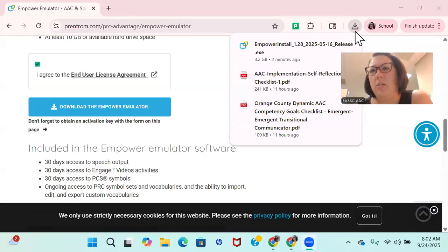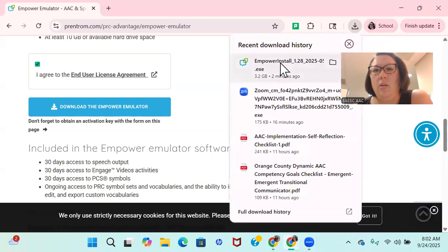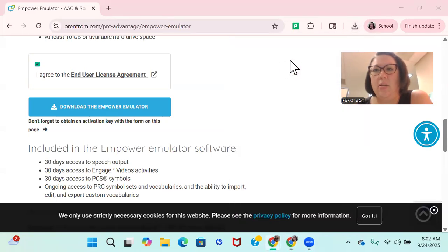Okay, so once your download is complete, you are just going to click on that download.